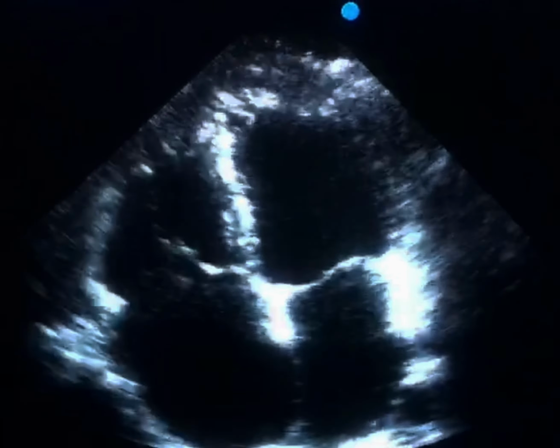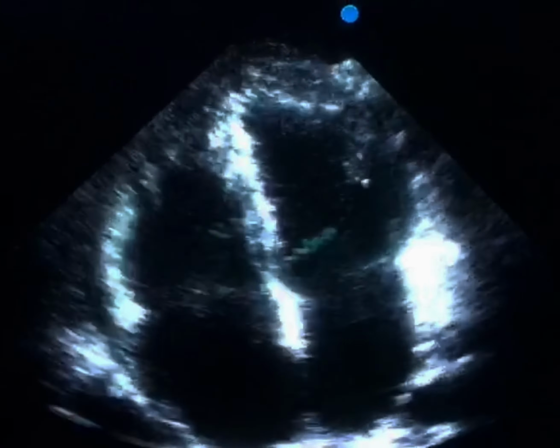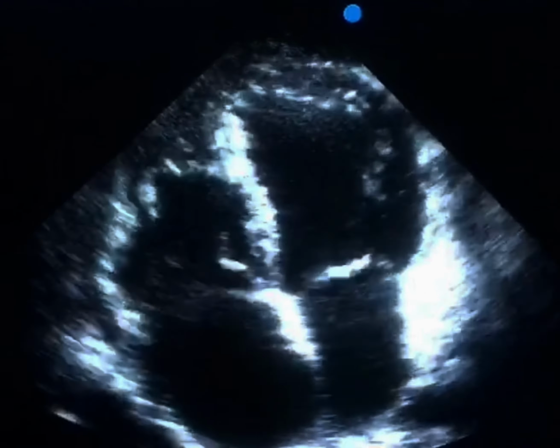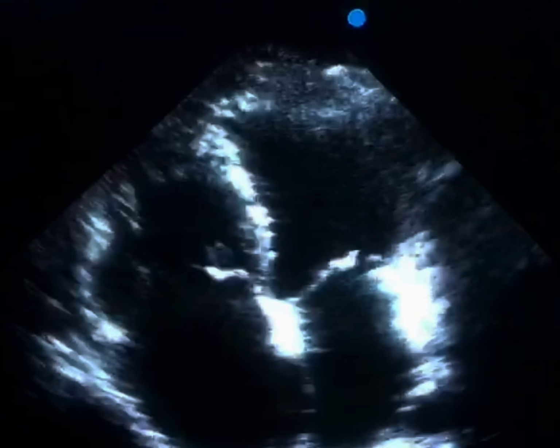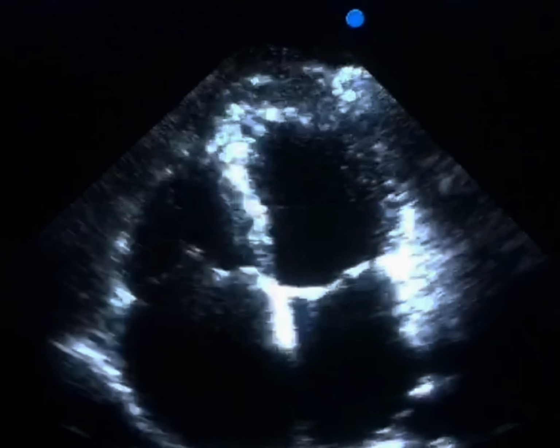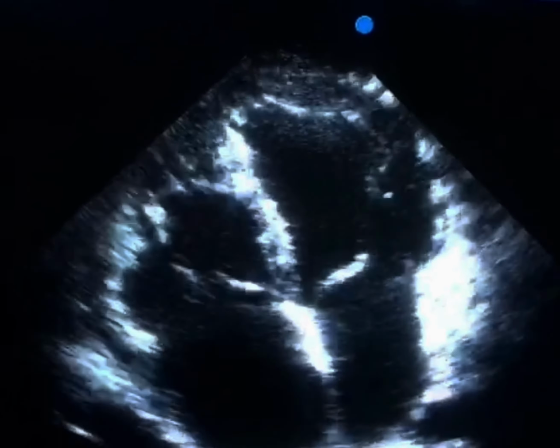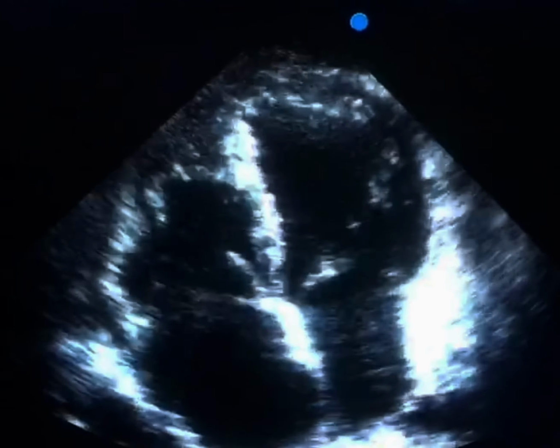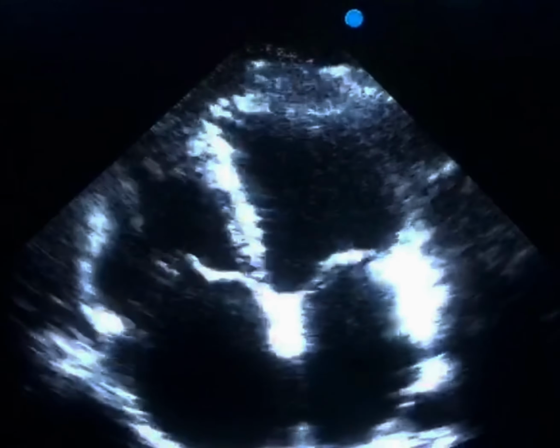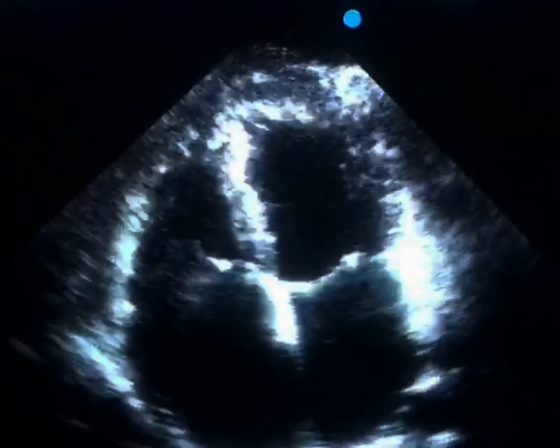Nowadays, the disease is referred to as arrhythmogenic cardiomyopathy, ACM, because the pathology is not exclusive to the right ventricle. Many patients develop biventricular involvement, as seen in this case. In some instances, the left ventricle may be more affected than the right, which is referred to as left-dominant arrhythmogenic cardiomyopathy, in contrast to biventricular ACM or classic ARVD.